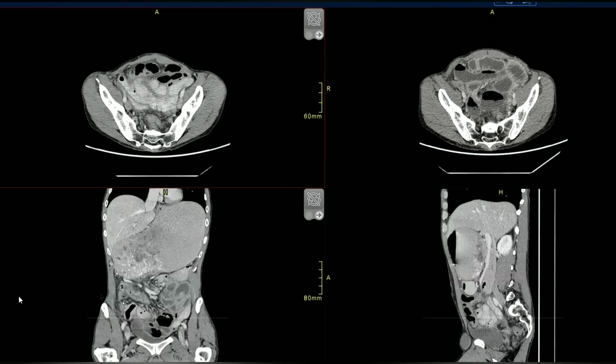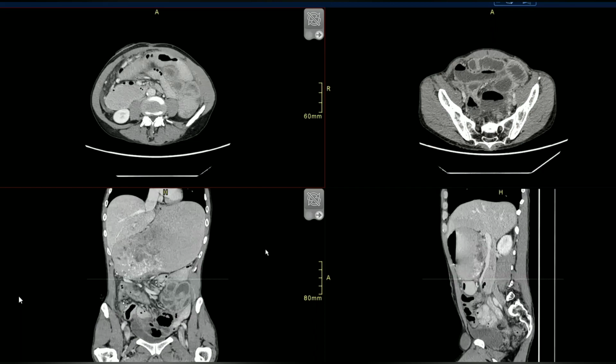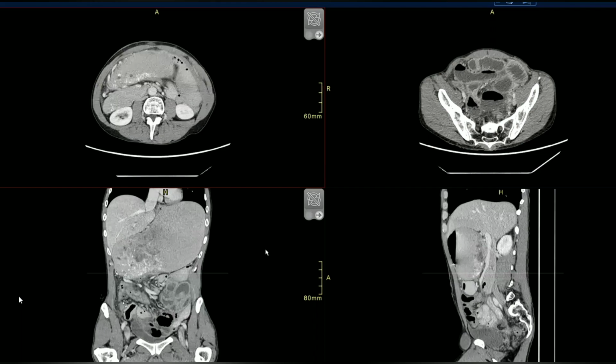So in a young patient, I would consider annular pancreas. That has caused proximal distension, so much distension of the second part of the duodenum, and I cannot appreciate any mass lesion in these images. So what's your diagnosis and what is your management? Okay. Ma'am, surgical referral should be done. My diagnosis is annular pancreas.